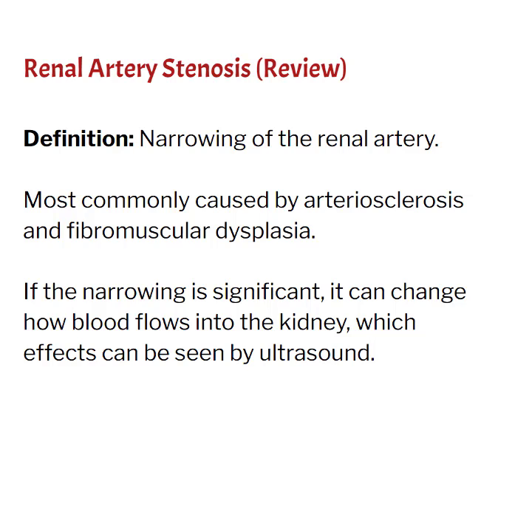If the narrowing is significant enough, then it's going to change how blood flows in the kidney. So we will see that with our Doppler samples. We can see how the kidney appears in itself, and we'll see it clinically with how the body regulates its blood pressure.